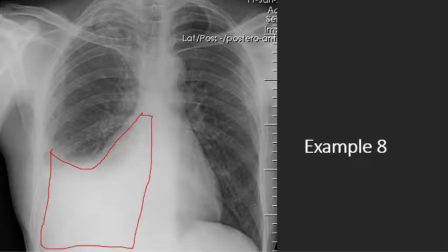This would be an effusion or an empyema. You don't know, obviously, by a chest x-ray. You need to follow up with a CT scan. So this needs to be evaluated further. And remember, this is where you would use your Light's criteria, your pleural LDH and your serum LDH and serum proteins, to determine whether or not it's transudative or exudative. And that's where you would apply that knowledge.